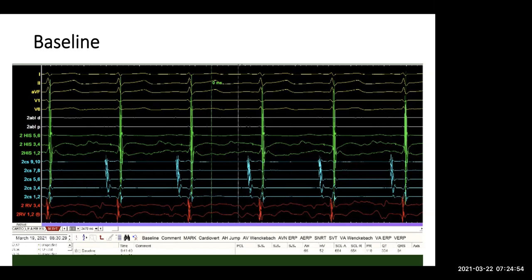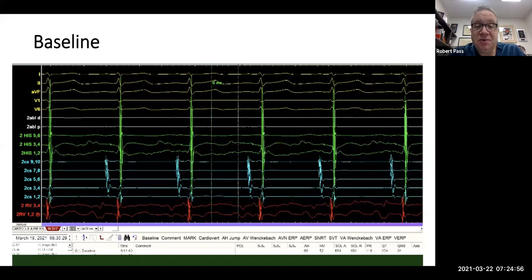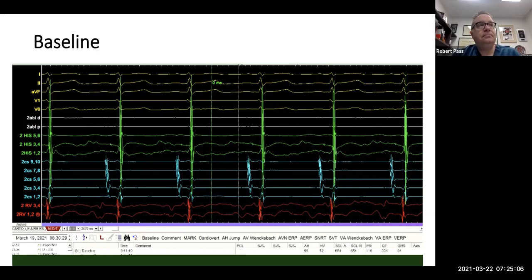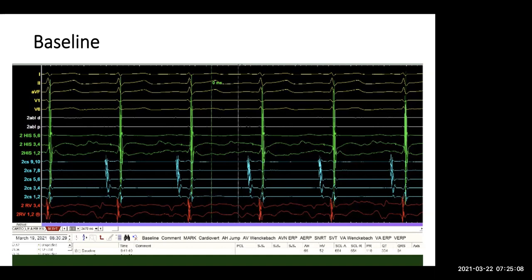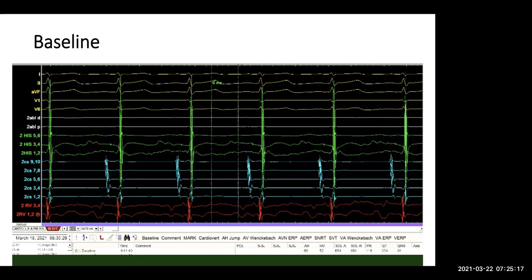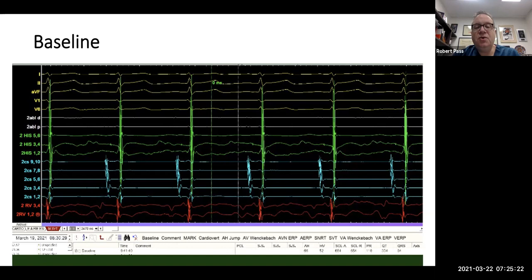Okay, please continue. So still consistent with the absence of WPW. So far, Dr. Mohan still is right. What else can I say from this? And also, it's hard, but I think they're all on time. So what are the normal His intervals? What's a normal AH and a normal HV roughly?